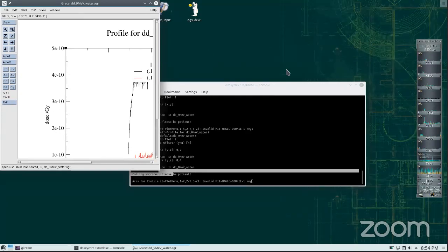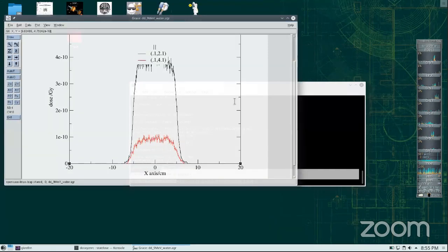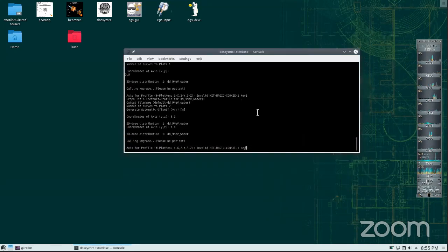So this is the profile. This is now the profile at Dmax. And this is the profile at 4 centimeters. I know this is at 4 centimeters because the dose, remember, it records absolute dose, or dose per particle simulation. So this is definitely smaller than the dose at 2 centimeters. Then you have the file, you can grab it, put it in Excel, make better plots, whatever you want to do. But with those XYZ, you need to use the stat dose application in order to get these profiles.